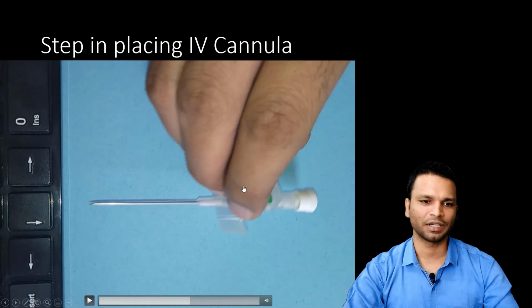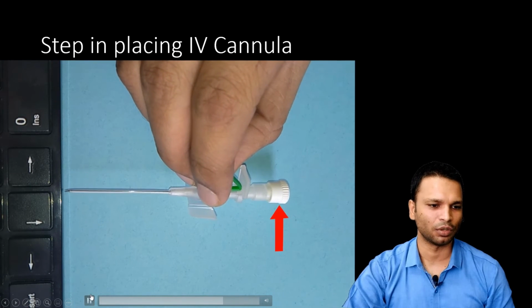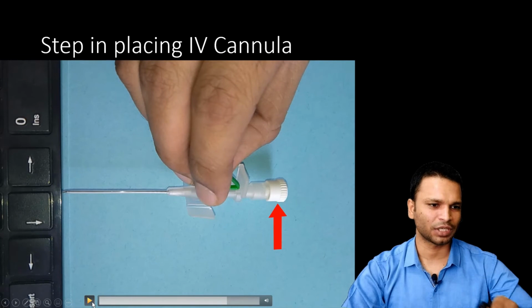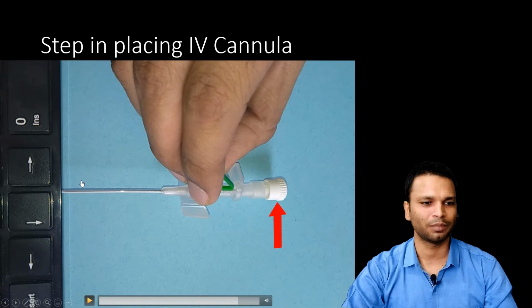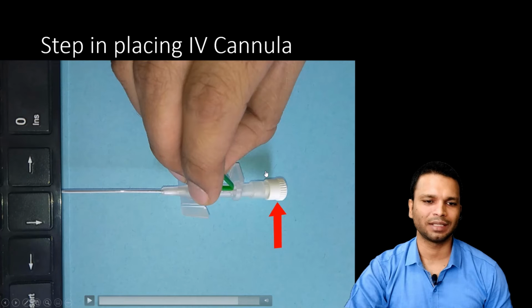Whereas now you can see my grip is my thumb and my fingers both are at the injection port. The thumb is not supporting the stylet. So what happens is when I push the IV cannula against the wall of the keyboard, you can see this stylet is being pushed back. Again, you can see the stylet is here. When I push it against the wall of the keyboard, the stylet is pushed back and the flexible cannula is not able to penetrate inside the skin and the vein. So always remember to support the cannula at the locking cap region or the stylet grip region.